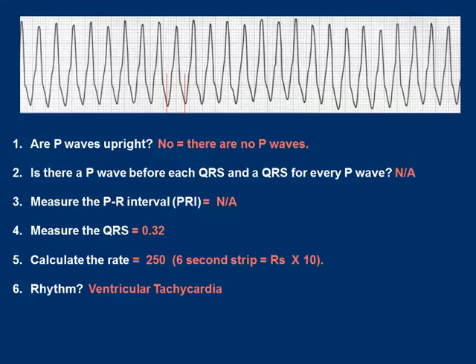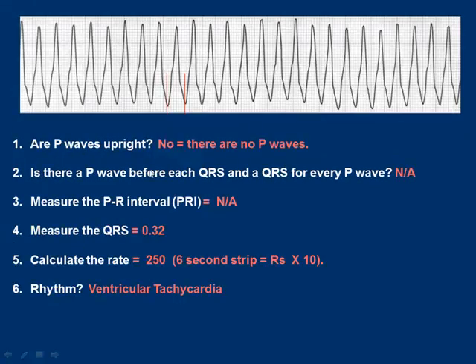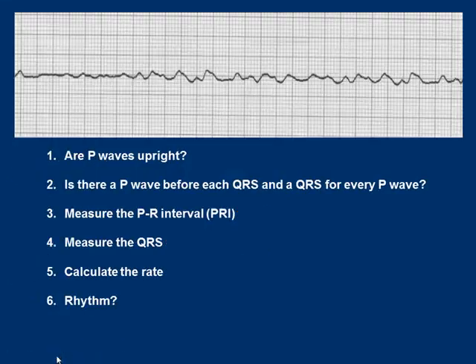We'll talk about treatments for these rhythms later on, but know that with ventricular tachycardia, anytime there are ventricular abnormalities, this is an emergency, and you would need to take care of your patient and address this issue very quickly. Let's look at this next rhythm.